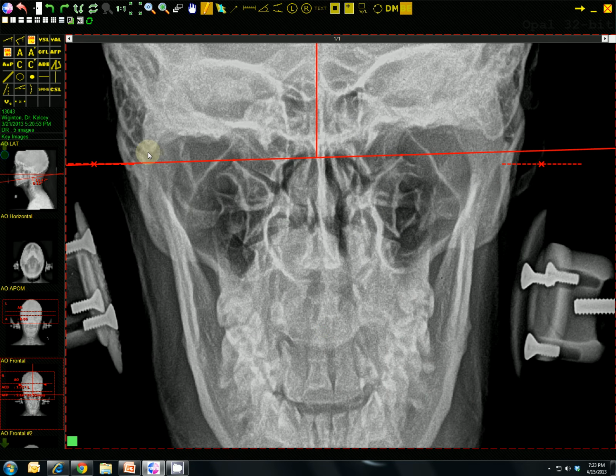We'll zoom in. Let's go ahead and make lines for the other ones. So you can see how the posterior arch comes into the lateral mass right there. So there's one mark, and we're going to follow this all the way right there also. Okay, and now the same thing for on this side. So here's the posterior arch coming into the lateral mass, and then following it around, posterior arch to lateral mass, extend it out, and then the inferior lateral mass.